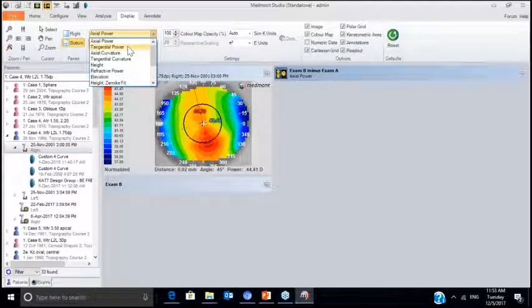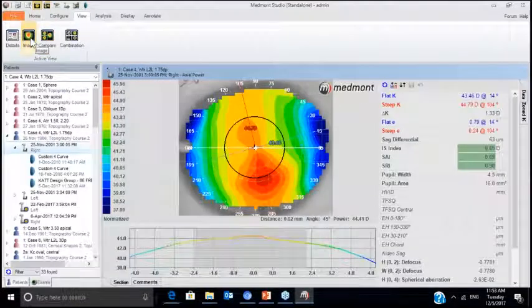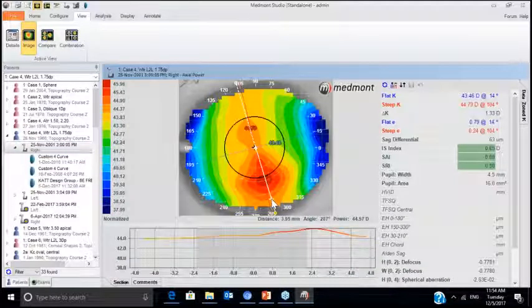Some people might think, as there is a bigger or more important red portion down below on this eye, perhaps it's a keratoconic eye. But if you look at the diopters and the relatively small difference, you can say it's not a keratoconic eye. But some people might think so initially, at first sight. I don't know what your point of view is on this.